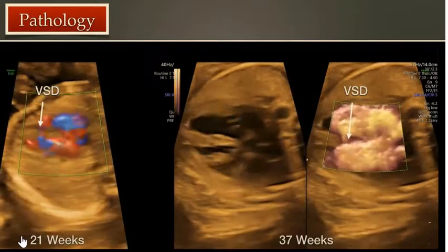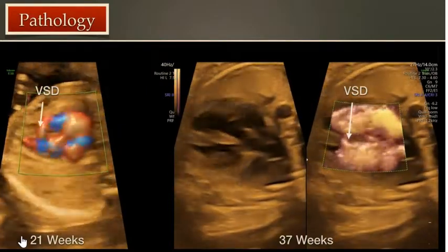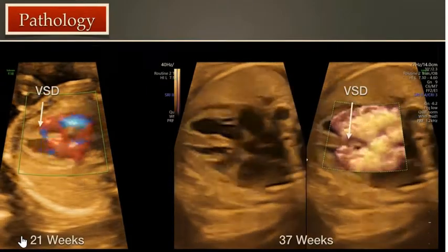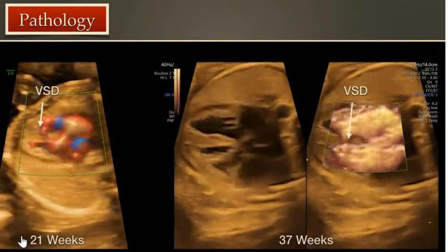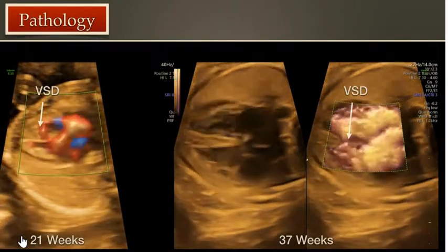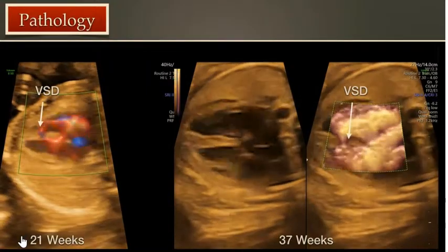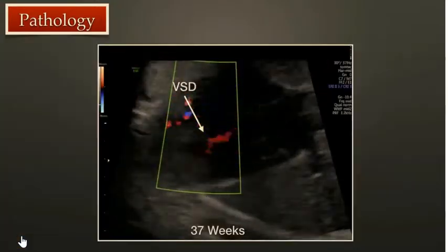This illustrates the value of power Doppler for identifying a shunting VSD that was not present on the 2D image at 21 weeks, as well as at 37 weeks. The reason for not imaging the VSD on the 2D image was because of the effect of lateral resolution and the small size of the VSD. This is another example of a small shunting VSD.